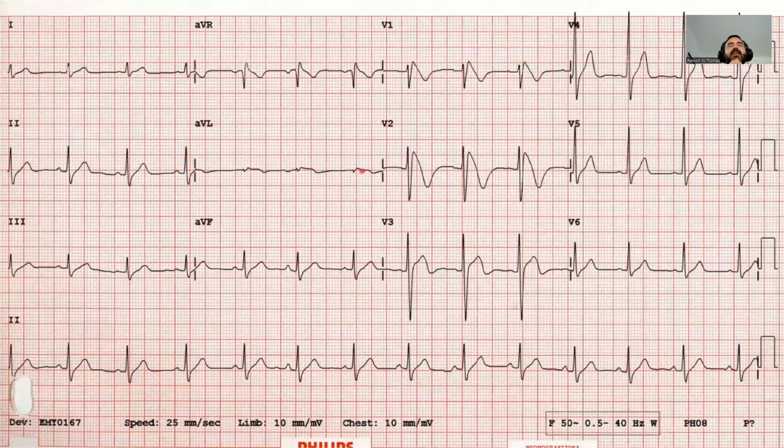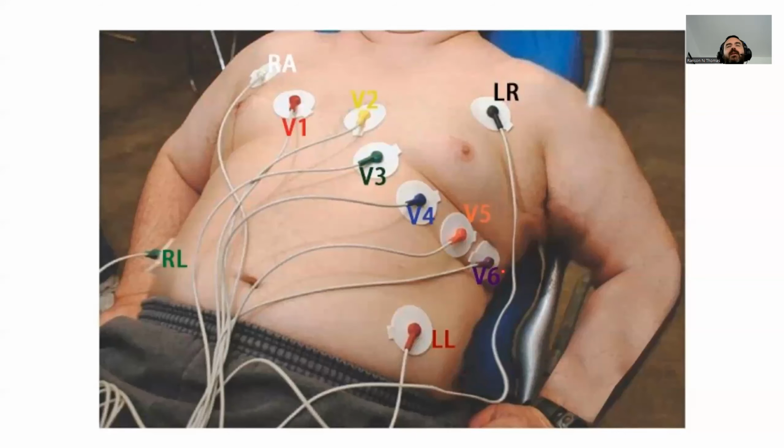This is a 12 lead ECG or EKG or electrocardiogram. And I'm going to go over the leads in a second. I'm going to skip around on some slides, so sorry if I'm giving you whiplash. These are the leads, right? We attach them to the patient. And then what we're actually measuring is the electricity flowing from one lead to the next.